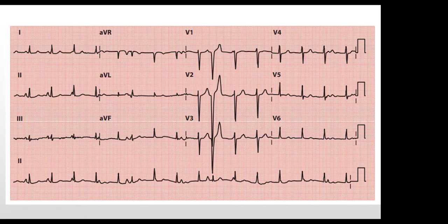First, I can see that it appears we're having multiple P waves of different morphology and different sizes, coming at different times relative to the QRS complex. So, boss, is this multifocal atrial tachycardia that degenerates into atrial fibrillation? Because at a point you're not really seeing anything at all.